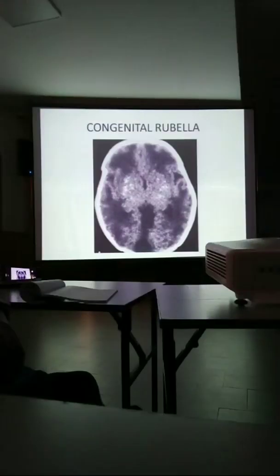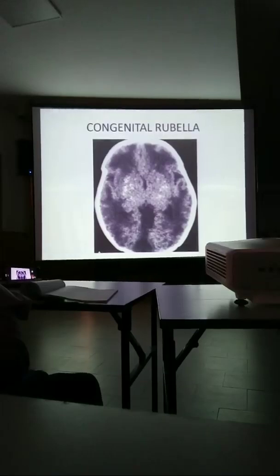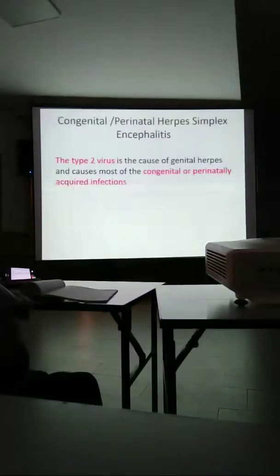Congenital rubella syndrome, where the white matter is hypodense and there are basal ganglia calcifications. HIV also you should think of whenever you are seeing extensive calcifications in the basal ganglia, apart from the common hypoxic ischemic brain injury, hemorrhage, and metabolic abnormalities.